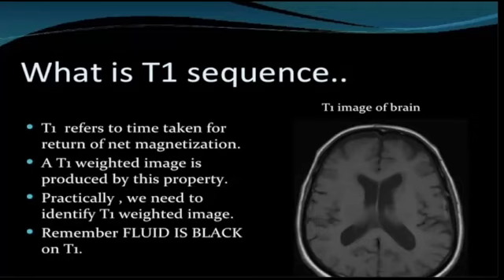Now, whenever you're looking at a T1 image, you will start seeing the darker substances. Whatever could appear as dark on an MRI from a T1 sequence will be stuff like inflammation, water, or any rapidly flowing fluid. Here, this is where the CSF is, and CSF is just like water. So when you're looking at this image, which is a T1, this should appear as dark because water appears dark on a T1 image. Inflammation should also appear dark, along with any rapidly flowing fluid. And by rapidly flowing fluid, I mean blood within the vessels.